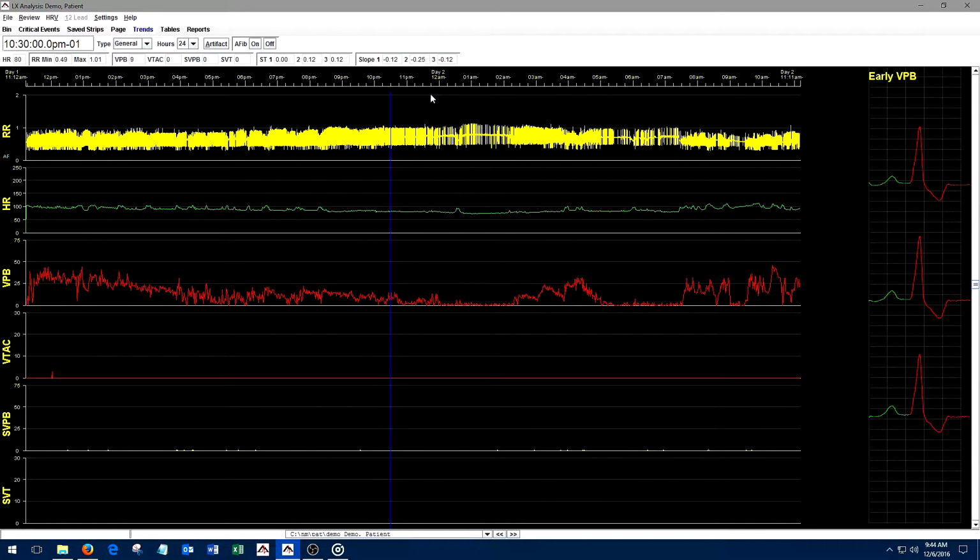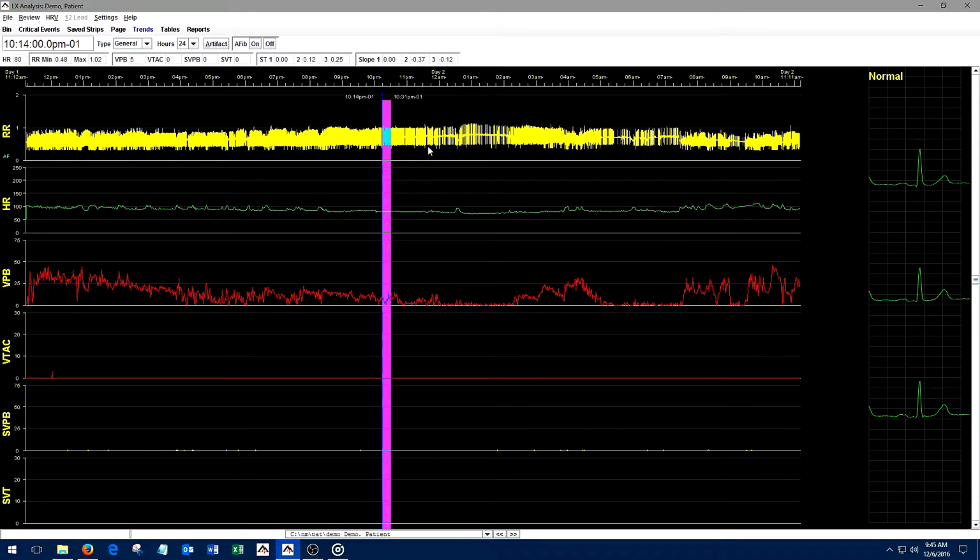ST Trend, Enhanced Plus and Pro levels only. The ST Trend screen presents the ST segment analysis data in 30-second increments throughout the Holter period for all channels of the ECG data. The placement of the ST calipers is automatic unless you reset them in the calibration window. See the section ST Segment Analysis in the previous chapter for more detailed information about ST segment analysis.